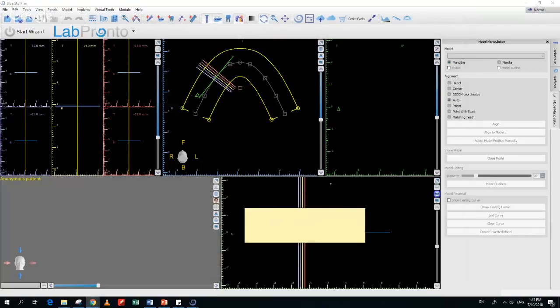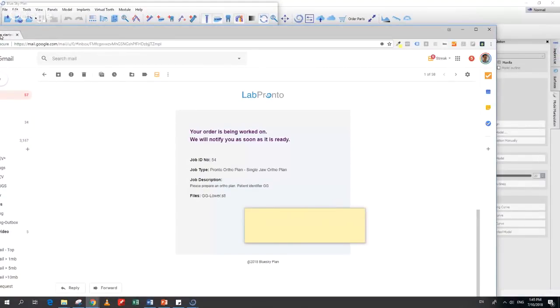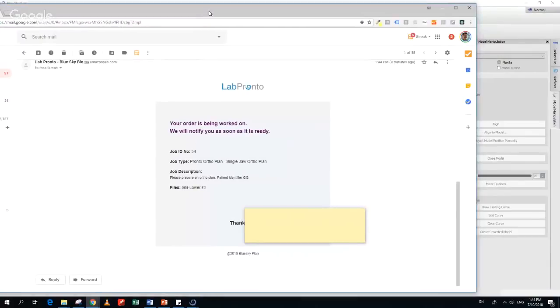And just to demonstrate, let me just see. Okay, so to my email account, now we can move this out of the way.